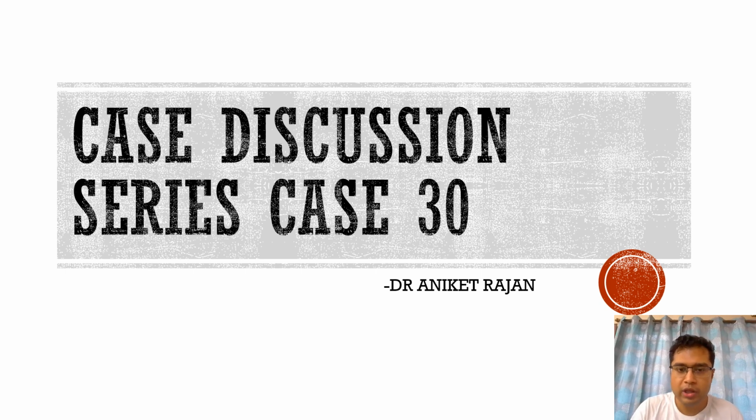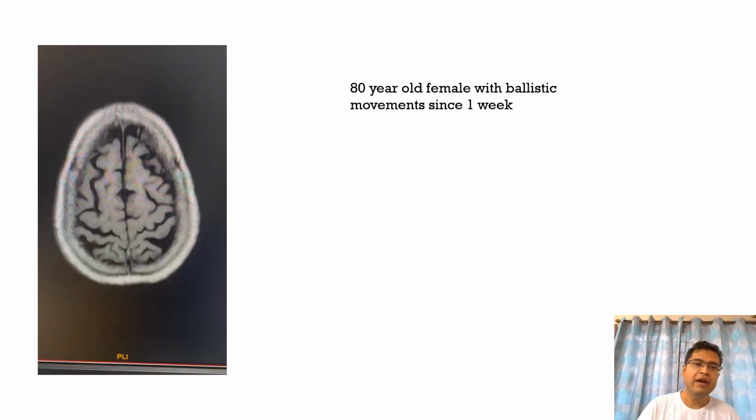So hello everyone and welcome to case 30 of this case discussion series, and today we'll be discussing a very interesting case. So here we have an 80-year-old female who came with unilateral ballistic movement since the past 1 week now, and this is the MRI brain done for this patient.